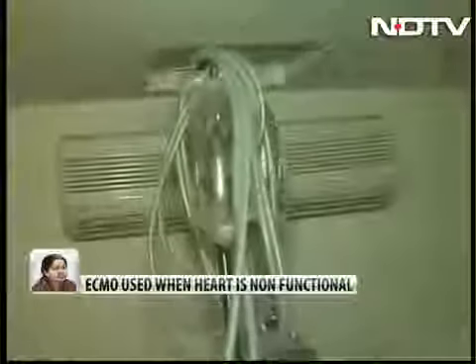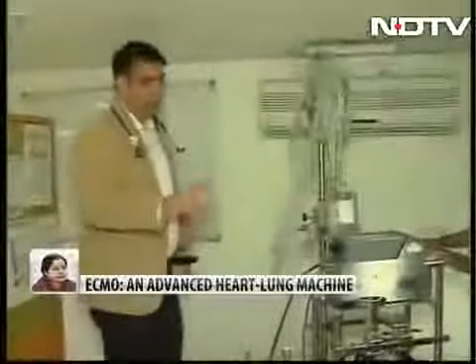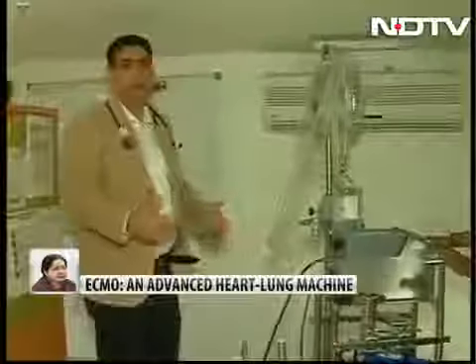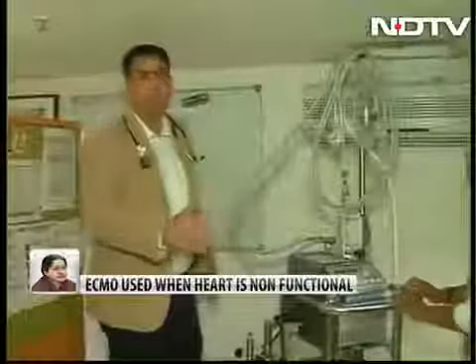There's an oxygenator which is not available here right now, that comes as a part of a circuit, and that maintains your oxygenation, and that's how it supports your heart and lung. It's also known as a long-term bypass machine, because the old bypass machines are only for 6 to 8 hours. This can be used for a couple of weeks.